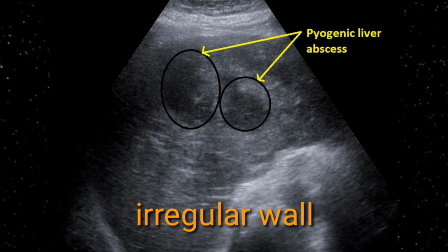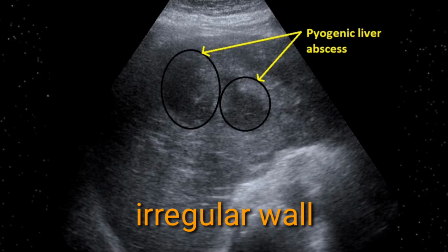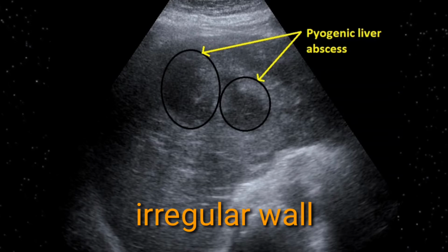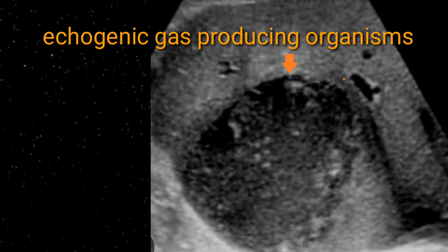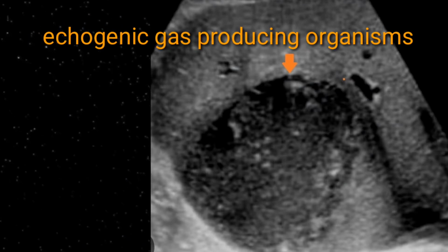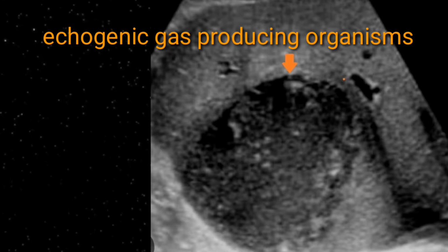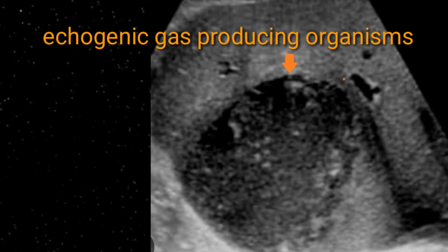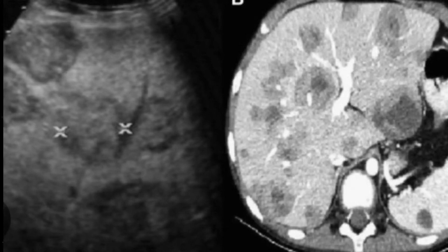Liver abscesses are very common and very easy to appreciate on ultrasonography. They show multiple presentations. First of all, there will be an irregular wall and the lesion would be hypoechoic. In another presentation, you will appreciate low level internal echoes, and sometimes there might be gas producing organisms which appear as echogenic foci within the lumen. You will appreciate low level internal echoes within the lumen of the lesion. On the ultrasound and on the CT scan, it will appear like this.